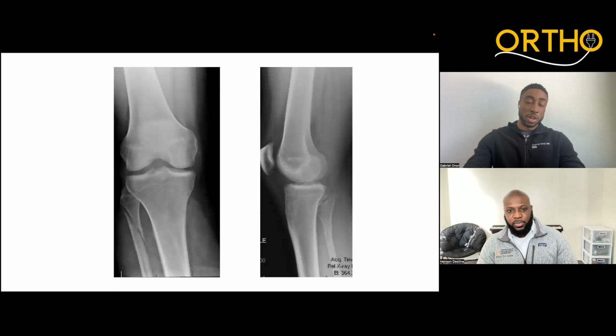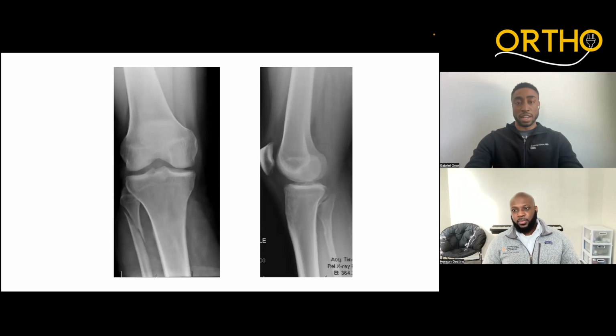And if you don't, then you would not have visualized that there also on this image is an AP and lateral of the knee, demonstrating an oblique fracture of the proximal fibular shaft. So as I mentioned again, anytime you get imaging and you see a fracture, make sure you have imaging of the joint above, joint below. Just get the entire bone in question.